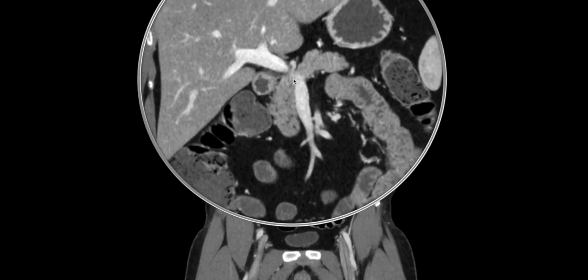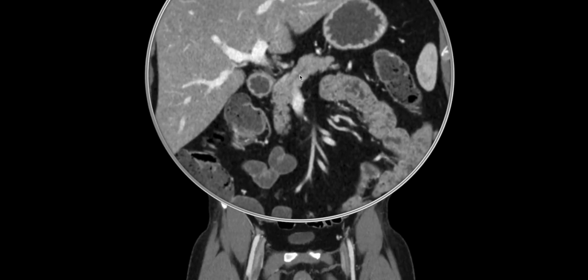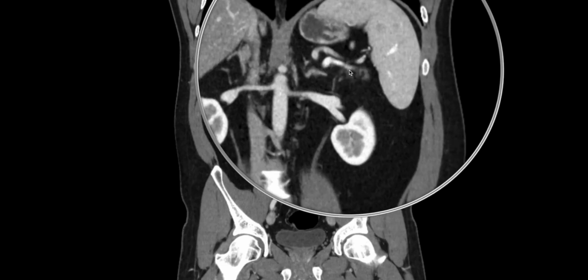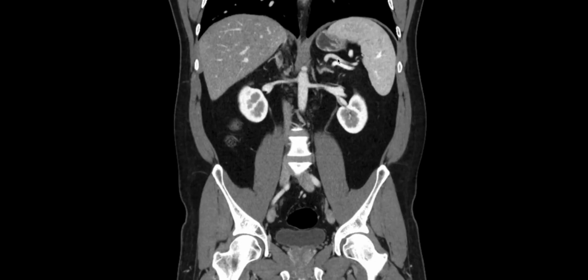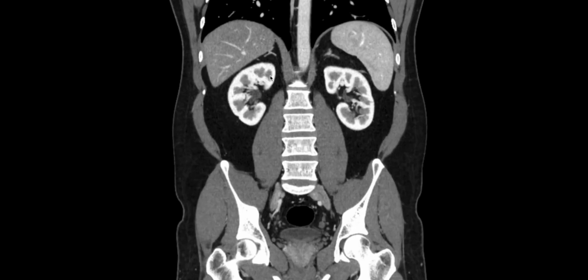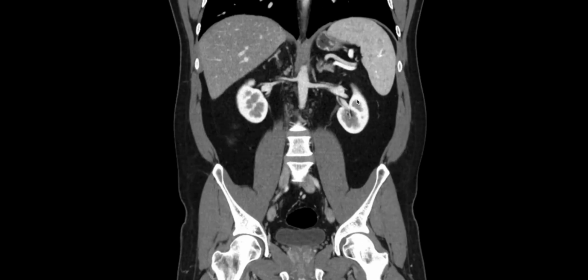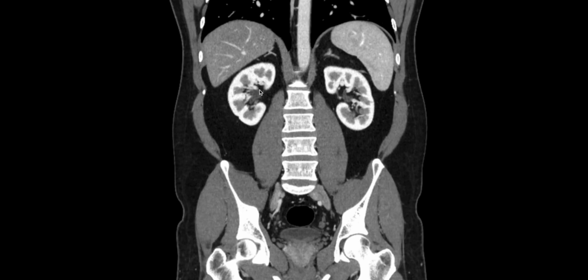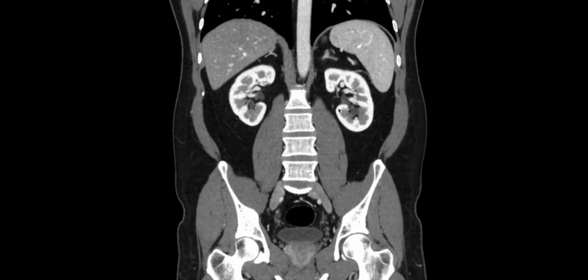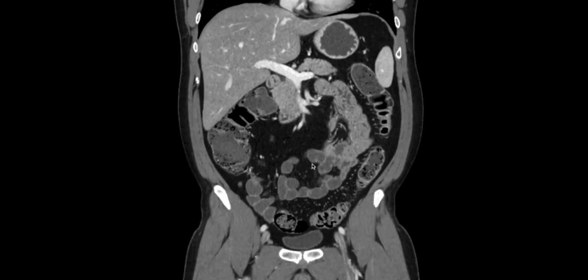And here we have the pancreas head, body with a portion of the pancreatic duct, pancreas tail, spleen, adrenal glands, and kidneys. And the coronal view is particularly helpful for looking at any asymmetry or abnormal enhancement between the two kidneys. And it can also be a helpful safeguard against overlooking a mass that might be easy to scroll by on axial, but really does stick out well on the coronal. So really important to look at the kidneys on coronal views.